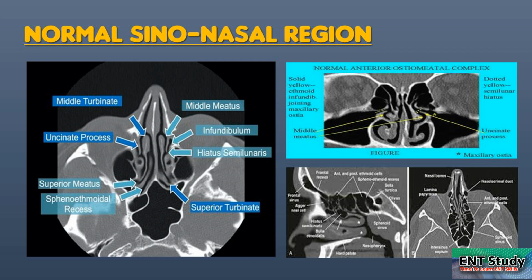So look at the symmetry of both sides. This is the most important thing. Then remember what things are in the midline and what things are on the sides. Look at the midline first. Identify the bony structures, where the normal air should be and where the soft tissues should be. The soft tissues are usually a bare minimum whitish line just lining the dense white structures.